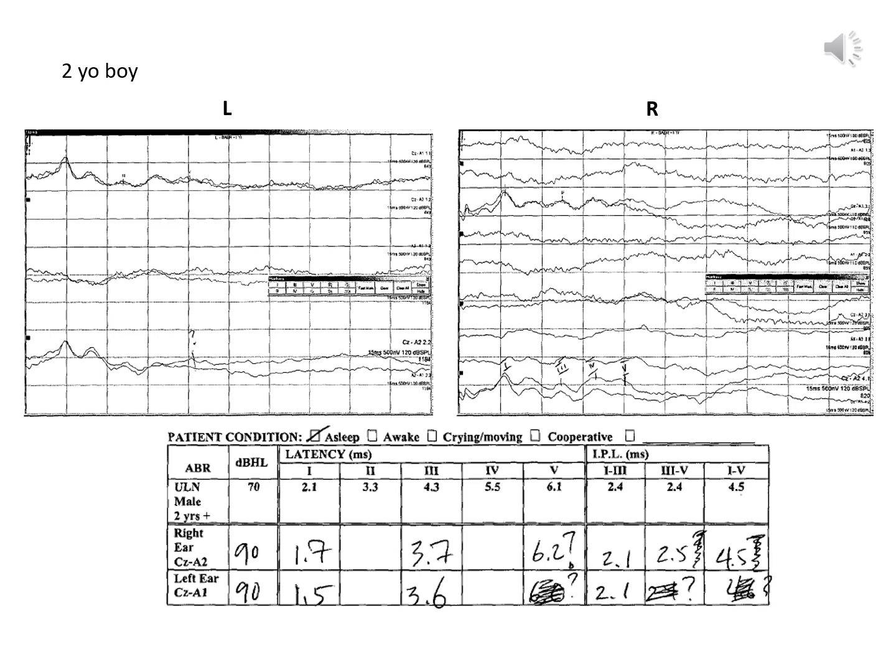And so for both of these ears, the best recording is at 90 decibels, as we see from the chart. And so the technologist has written a bunch of numbers in for us. And so we'll note that the wave 5 for both ears, on the right ear, has a question mark, because it's very hard to be confident that we're identifying the wave 5 even at 90 dB. And then on the left, the wave 5 is really not present.